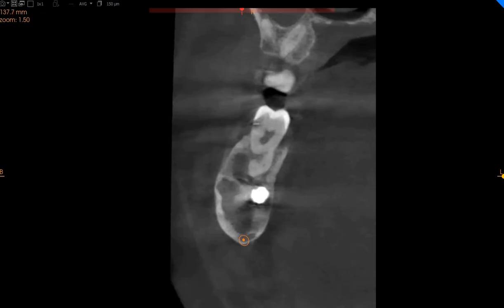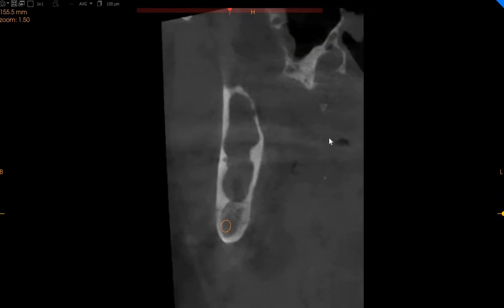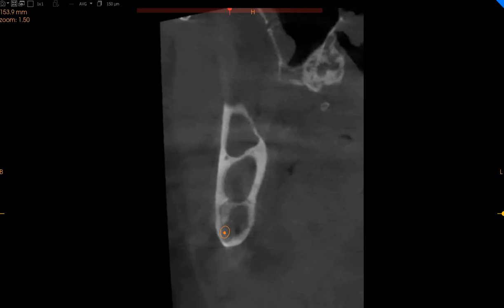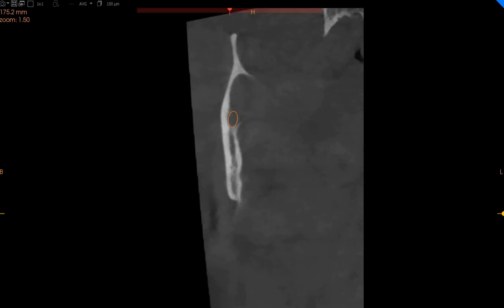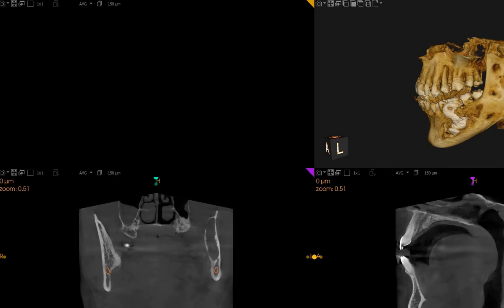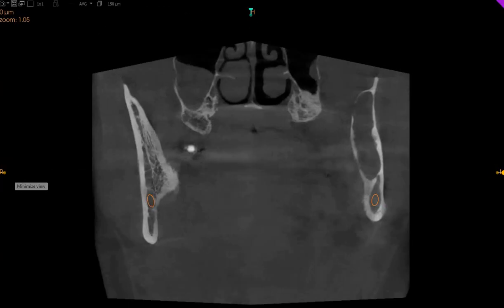This is a multilocular radiolucency. You can also see that as we move towards the ramus, the multilocular radiolucency develops here also. It has three particular distinct lesions in this part, and then the posterior part of the mandible can also be seen. We'll take you to the coronal sections, which will give you an idea of the radiolucency and compare it to the mandible.